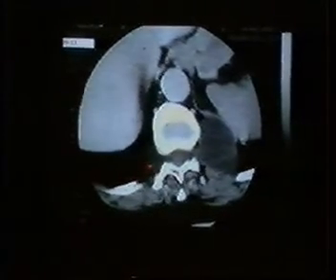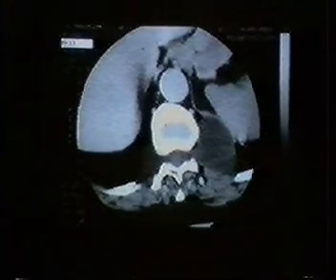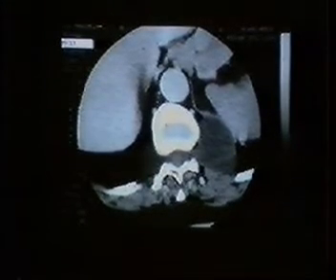There's a large mass here seen a little bit through the heart, better seen perhaps on the lateral view, clearly posterior in location. And at CT, it's very clear that these are water attenuation. It turns out they're bilateral lateral meningoceles in this patient with neurofibromatosis. CT would be a nice, easy, non-invasive way to make that diagnosis.